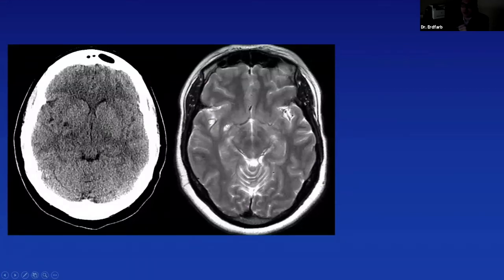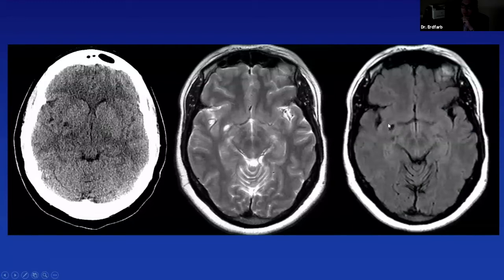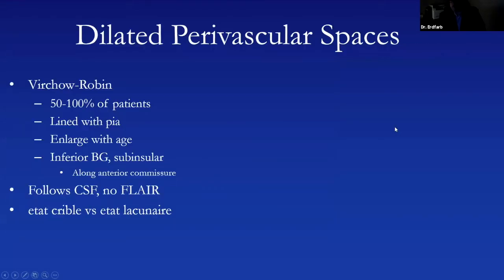But on MRI, again, you see a well circumscribed T2 bright lesion without a lot of edema around it, no gliosis surrounding it, very well circumscribed. And that, of course, is a dilated perivascular space. And major differential consideration there is going to be a small vessel infarct. But for a small vessel infarct, you would expect to see the surrounding gliosis. That's if a perforator vessel gets blocked or dies due to microvascular disease, diabetes, hypertension being common. You could lose some brain.